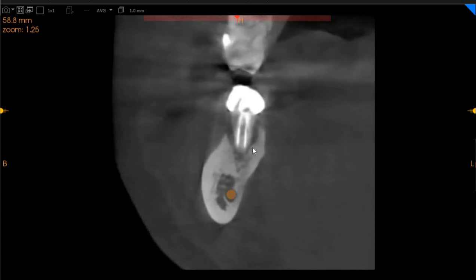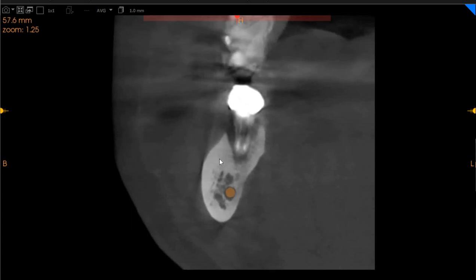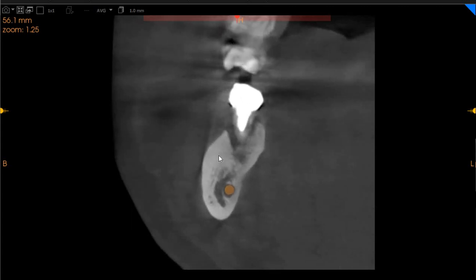When we move on to the mesial root, you can see both the mesial canals have been obturated, but we have significant bone loss, and this tooth is most likely grade 3 mobile. We've got very thick cortical plates, so implant placement needs to be done keeping this in mind that there is no vasculature in the lower right second molar buccal cortical plate, so the implant will need to be placed more towards the lingual area so that more vasculature can be obtained.